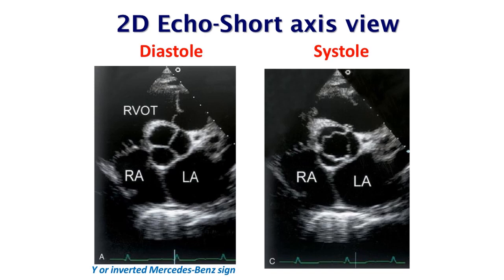Notice that the level of the mitral valve coincides with the basal left ventricle, and the level of papillary muscle coincides with the mid cavity or mid segments of the LV wall, and we can also get the apical LV, but I won't go through this today, it's advanced.